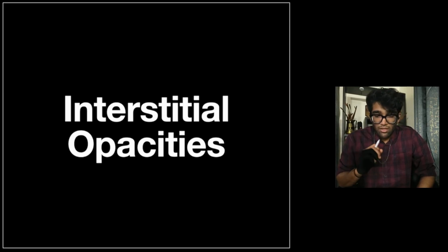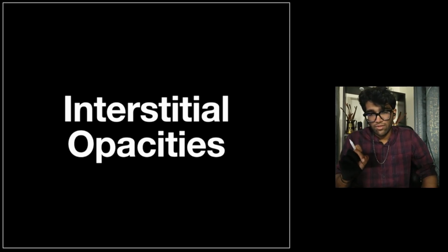Now you would have noticed that I have not given you differentials for consolidation, atelectasis or nodules, because these are considerations that warrant a lot of clinical consideration before you analyze the image, and the image usually, under most circumstances, will not give you anything other than what you have gleaned from your clinical status. So right now I want you to only understand that isolated ground glass opacities have a narrow differential. The others have a very wide differential. It is very important to analyze that in the right clinical context.